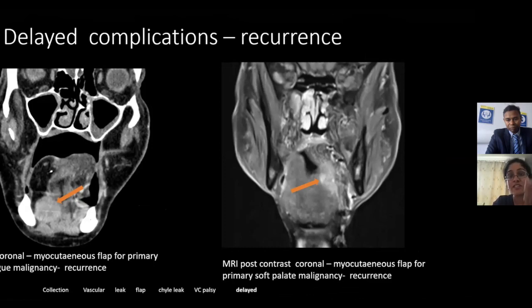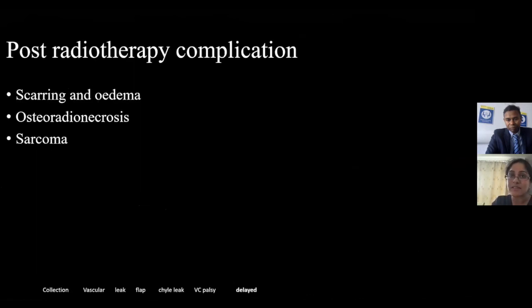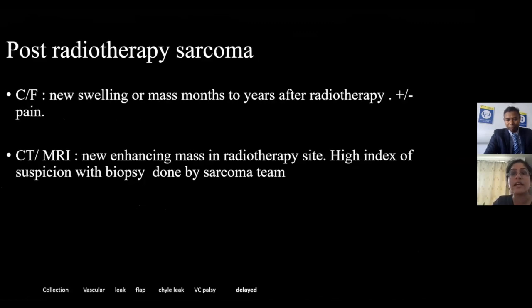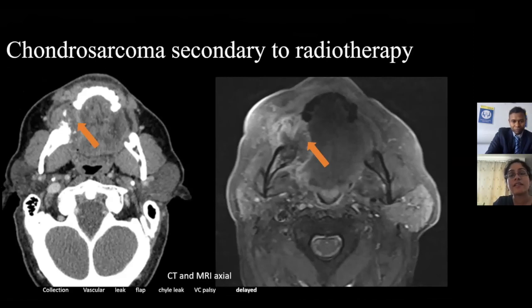Delayed complications, we have touched upon recurrence. You know what recurrence looks like. It is an unnatural enhancement. Sarcomas have a very specific look, and they are usually in the radiotherapy field, and again, a high index of suspicion is what drives the diagnosis of sarcoma.